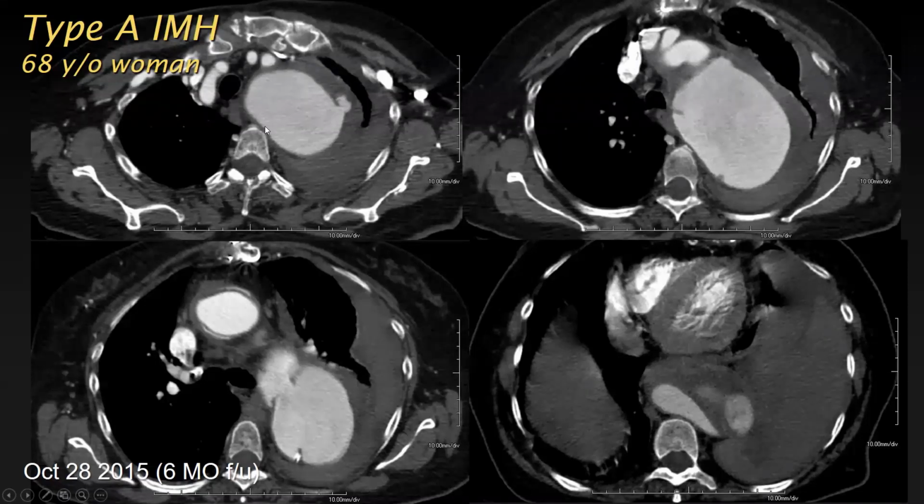You can see the descending aorta has overall grown substantially in size, so it has become aneurysmal. There may either be a new IMH or still part of the original IMH, but usually it would get thinner. Now you have a new intimal defect here, and you even have two filling defects here. So you wonder if this is a partial thickness tear of that false lumen. So this is a dramatic increase of the aortic size.